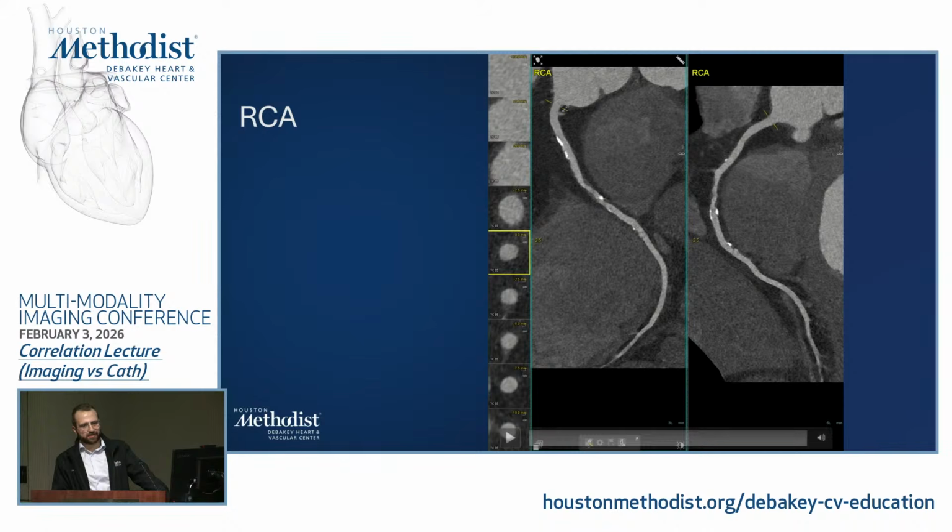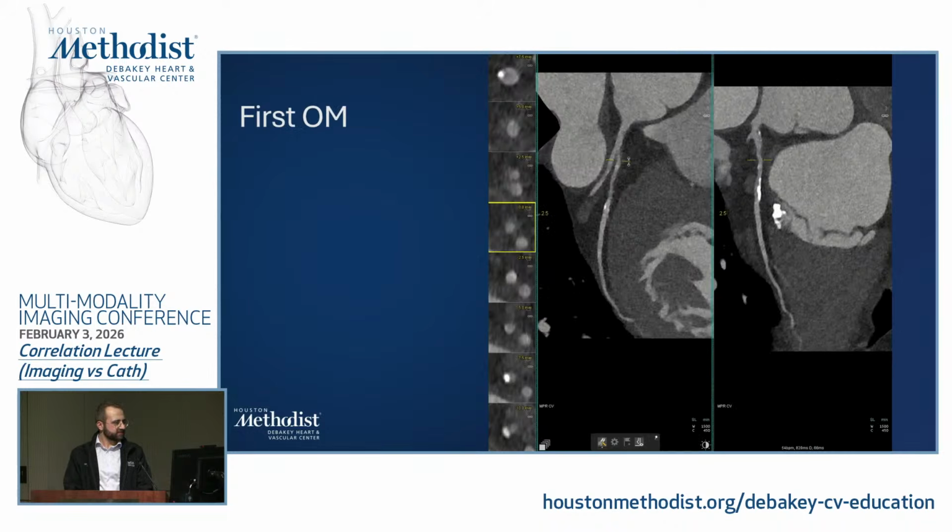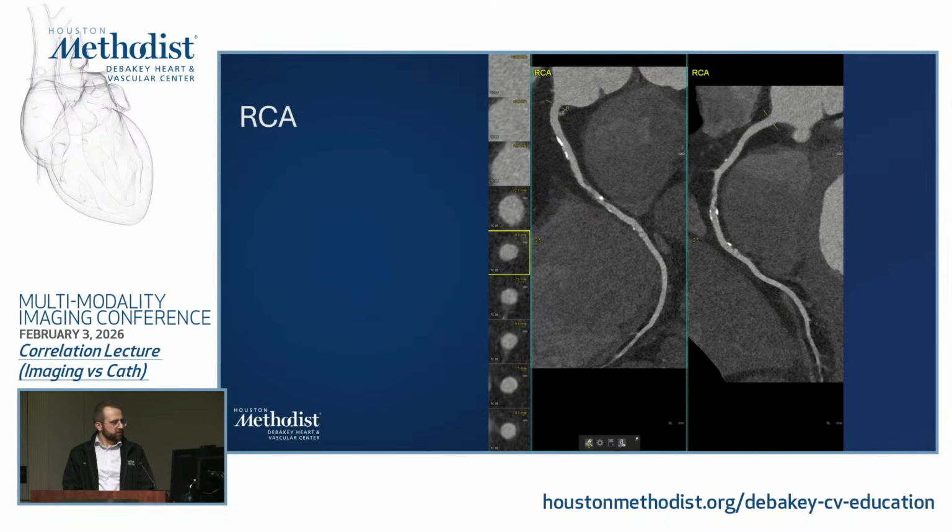I mean, we can't blame it on balanced ischemia, right? Exactly, that's the point. It's not balanced ischemia because you don't have disease in the right. So the most severe lesion was the OM1, and I think the LAD was non-obstructive. Right. The RCA had the moderate lesions. It was read as 60 to 70, yeah.